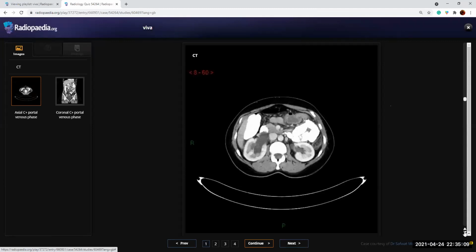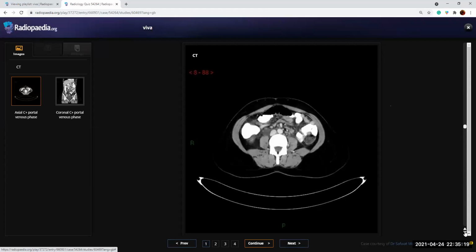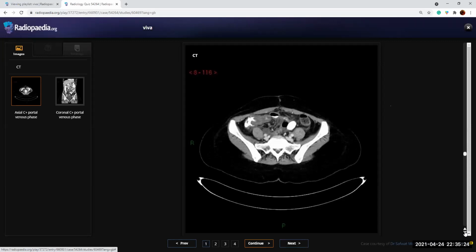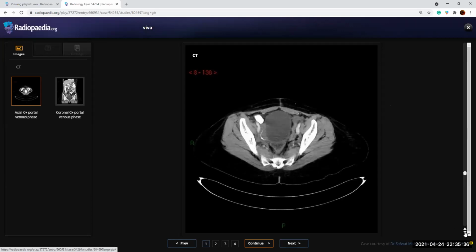There is also mild hydronephrosis and hydroureter at the right side. This I will have to follow. So the dilated ureter is coursing still here, but it's getting less dilated. It could be implicated in the inflammatory process around the terminal ileum. So this could be the reason for the obstruction, but I don't see any stones.